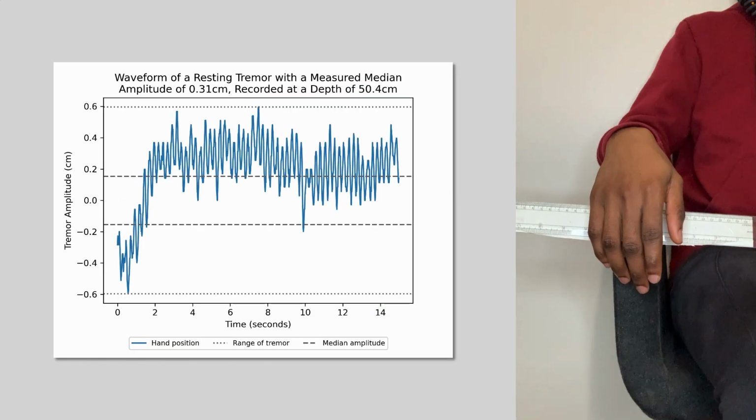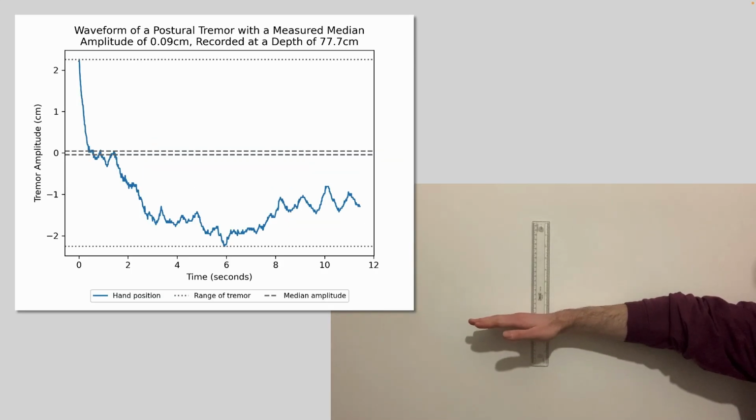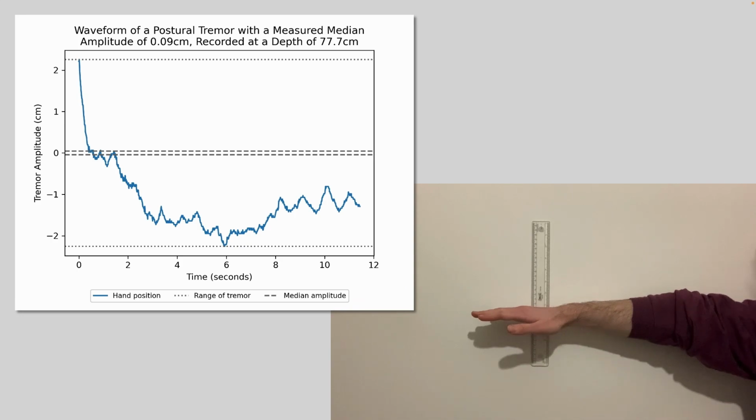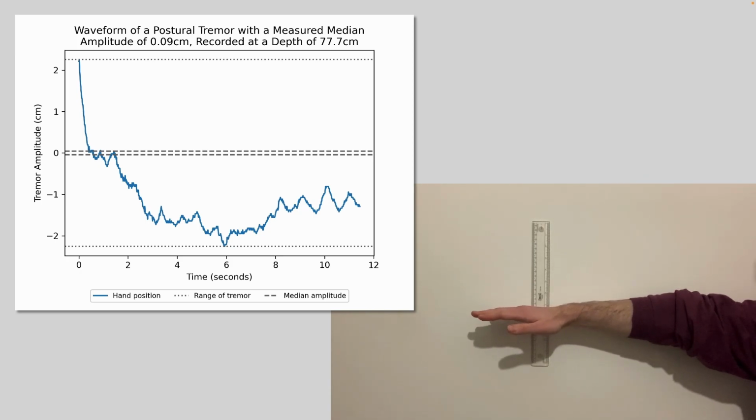Small tremors can be measured accurately too. For example, resting tremors between 0.15 and 1 centimeter are measured with an error of just plus or minus 0.05 centimeters on average. The method is also excellent at identifying when a video depicts no tremor. Tremor is still accurately measured even when the hand moves around in the video, because amplitude is measured as the median of the size of each individual tremor, rather than just the range of movement. This particular example shows this very prominently.